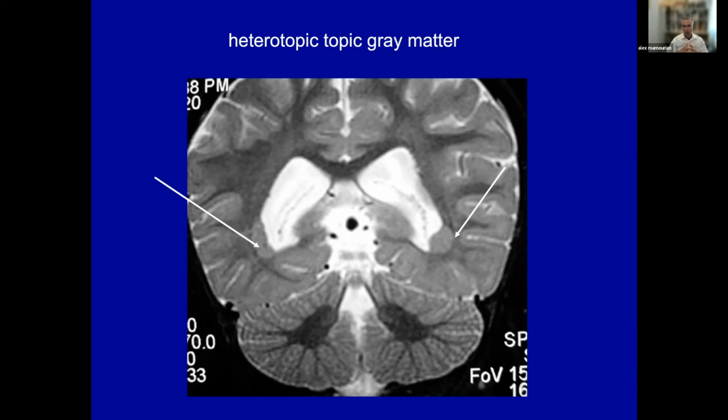However, the way you can discriminate this from, say, neoplasm and other structures is that signal will follow that of the cortex. So this is a migrational abnormality. When these areas of heterotopic gray matter are adjacent to the hippocampus, they can be a source of seizures, although any heterotopic gray matter is suspect that they may be involved in the seizures.